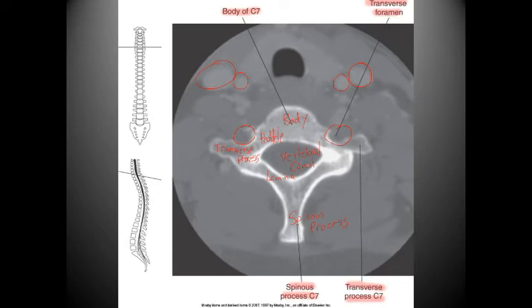And I believe that is pretty much all the relevant structures on this image.